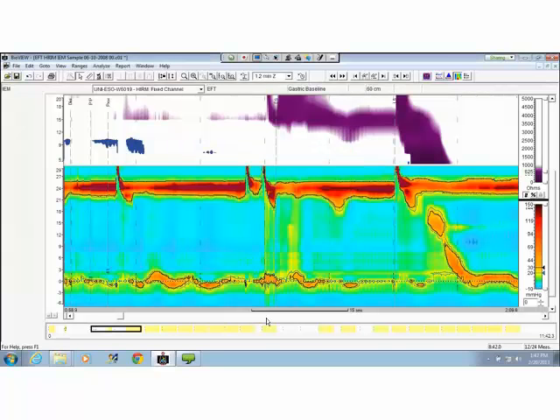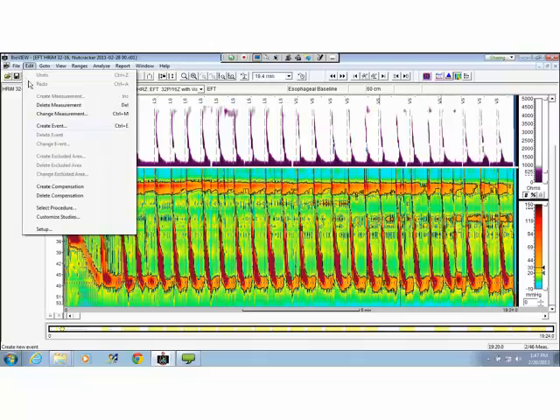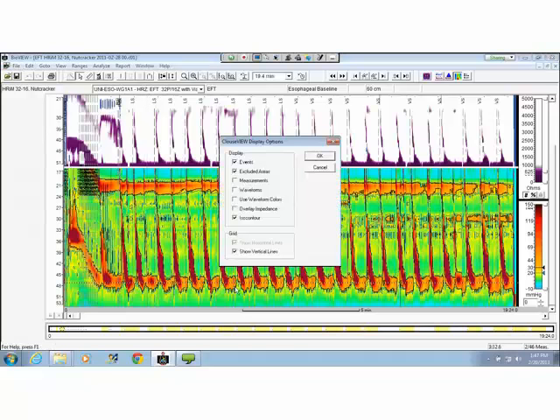You should encompass the entire propagation of the swallow. So even if it goes out quite a bit longer, by the way, the measurement boxes that I turned on, that were your traditional measurement boxes, don't let that limit the size of your Chicago box. So I'll show you on this study. I didn't have this one ready to go yet, but I can pull this up. There's already a compensation on it. I'll turn on the measurement boxes. ISO contours are already set.